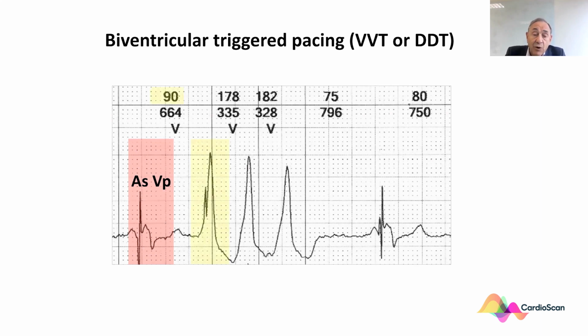You can see in the yellow highlight that the QRS is sensed and the stimulus artifact is in the middle of it. The next two, blue highlight, are not triggered because they are too early, and you can see from the blue highlight on the numbers that they are at a rate of 180 beats per minute.